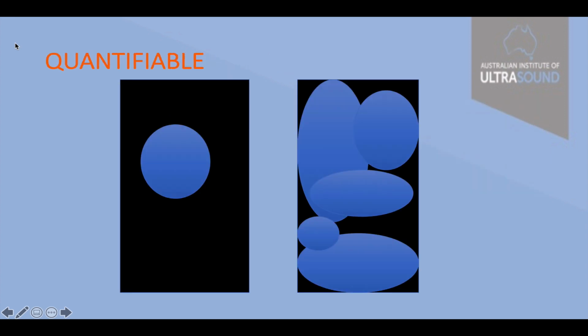Another thing about fluid is that we can, to some degree, quantify it. It's pretty hard to actually give measures or volumes with free fluid, but we can make estimates of a large amount or small amount.